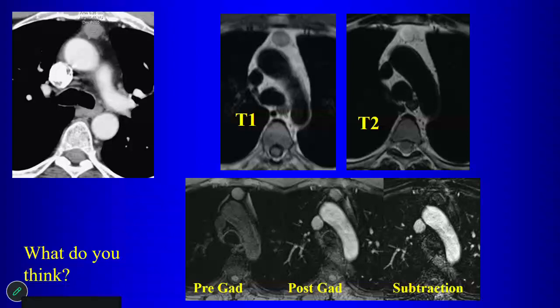Cyst. Yeah, so this is a thymic cyst. And thymic cysts can be high attenuation on CT scan, even non-contrast or post-contrast. You wouldn't expect enhancement of these on CT. But they can have proteinaceous fluid, so on CT, they can mimic solid lesions. And this is where MR can be helpful to differentiate solid from cystic lesions.